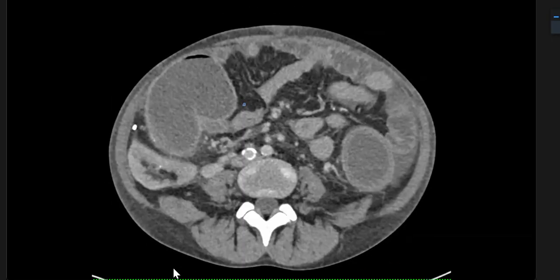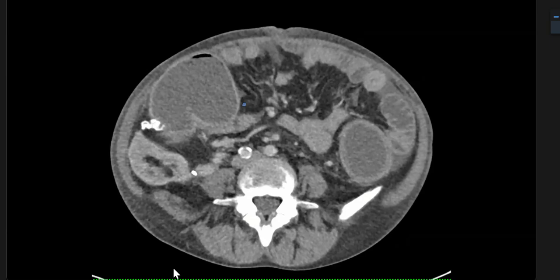That's it. And then you can talk about the native kidneys being significantly atrophied, and I can see the transplanted right kidney. Any history of transplantation? Because the native kidneys are completely atrophied, and this argument is supported by the surgical scar. Finish. In 5 minutes, you have finished the case, and that's it.